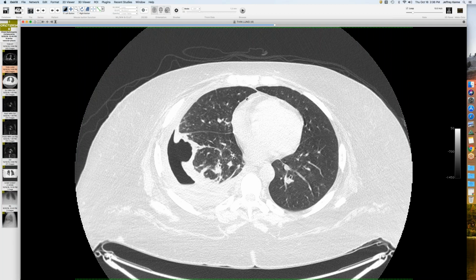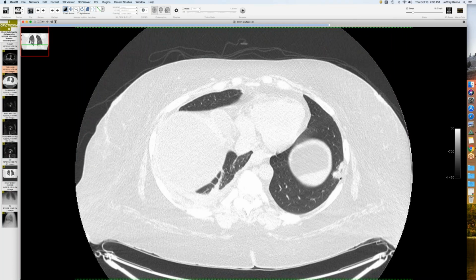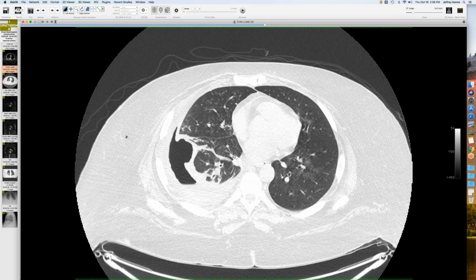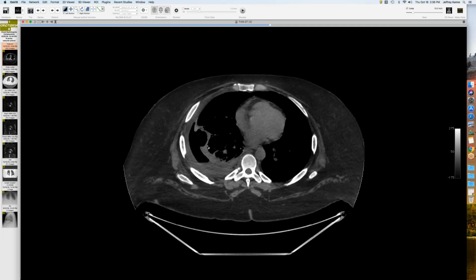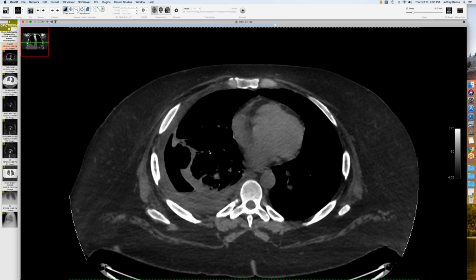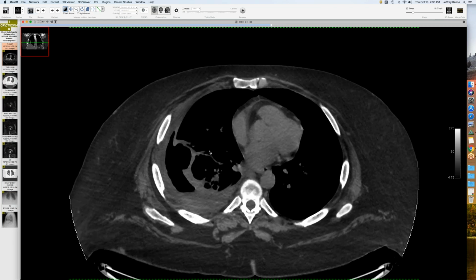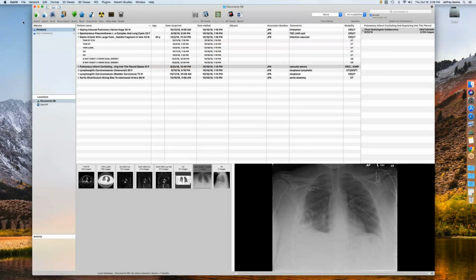It turns out this patient has alcohol abuse, drinks a lot, probably an aspirator, hard to be 100% sure. There's another little infarct out here. But I wonder if this thing got super infected and then caused empyema. Have any of you ever seen what at least looks like a bland infarct rupture into the pleural space? No, I've seen cavitating infarcts, but not that, I don't think. Right. The cavitation itself is so rare, and this thing got big, but somehow it had to erode through the pleura and spill in there. They had to manage this as an empyema with a fistula.